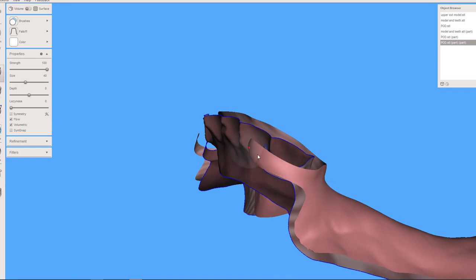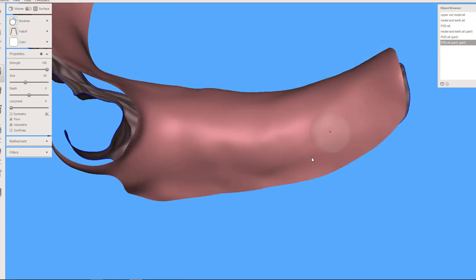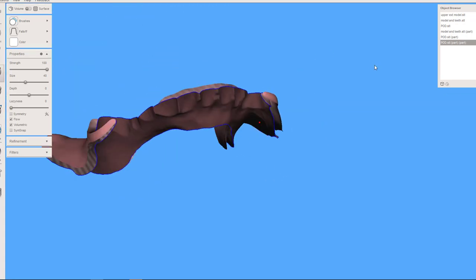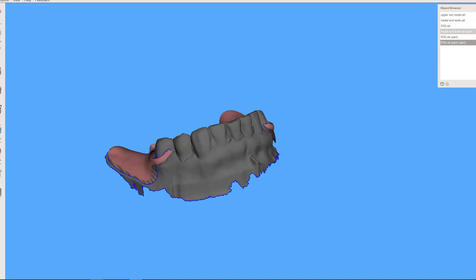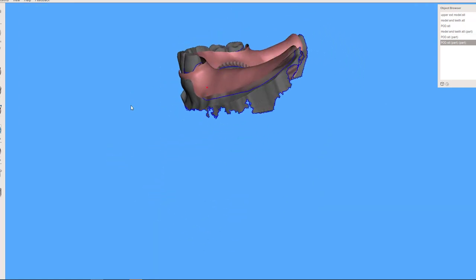Okay, the clasps, they got grown in every direction, so I'm going to knock them back a little bit, shrink them down. There's not necessarily a right or wrong to this. If you don't like something, just use your tools to tweak it, add to it, subtract from it, whatever you need to do. But now we're looking like something that's going to be a little better, okay? And just to give you a reference of what that looks like.